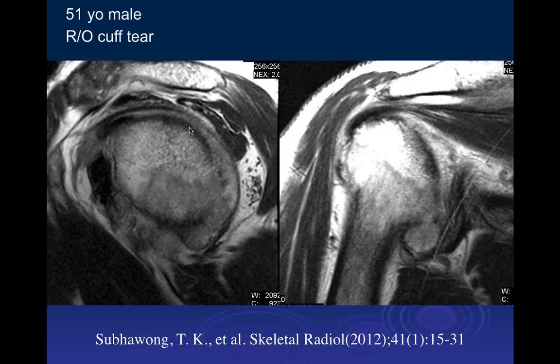Okay, so we have a sagittal T2 and coronal T1 weighted image of the shoulder, and there's a distension of the joint space with some intermediate signal intensity fluid. I see it more posterior inferiorly, and in the axillary pouch there's some fluid too.